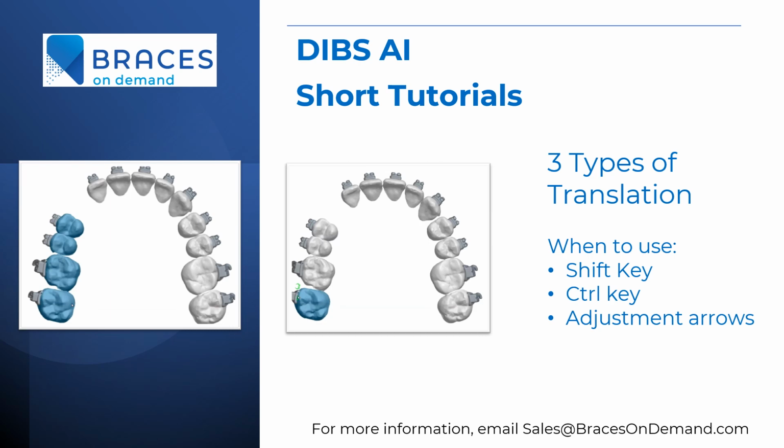If you're watching this video, it's probably because you are going a little nuts trying to mesialize or distalize a tooth without moving the entire arch. So why is this happening?